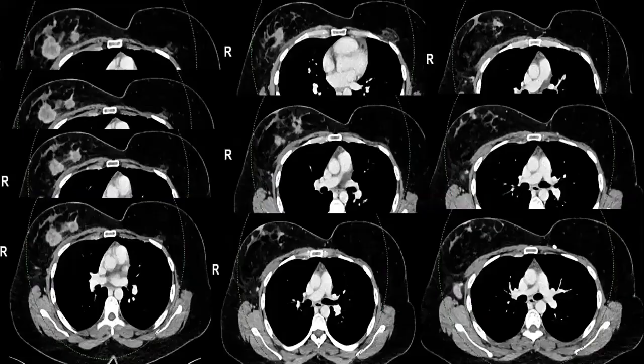And if we look here, have you seen? These are the satellites adjacent to two big lesions at the posterior breast. Look for the ductal extension here, and look for the ductal extension between the two lesions, interconnecting. This is ductal extension, and these more anterior multiple satellite nodules, you see, this is abutting the nipple with nipple enhancement, suspicious for nipple involvement.